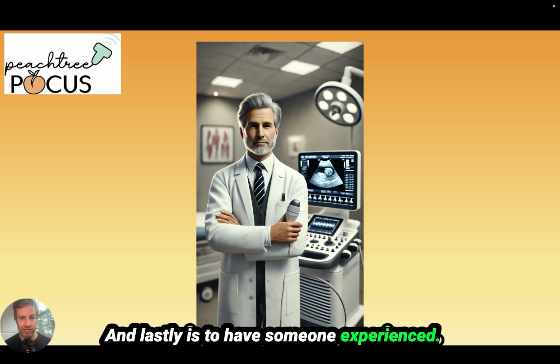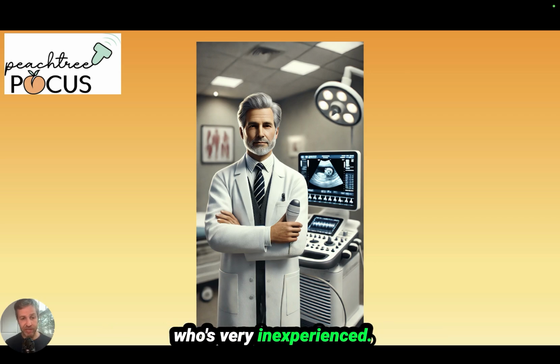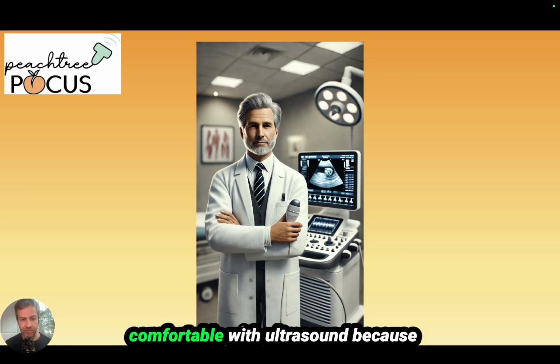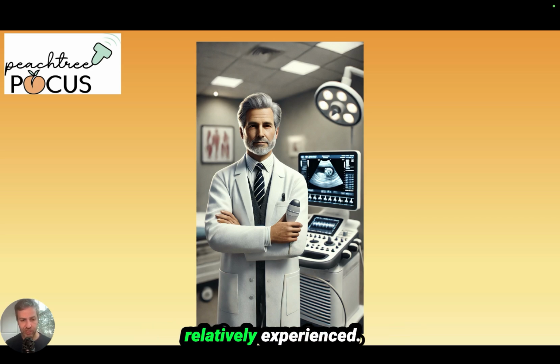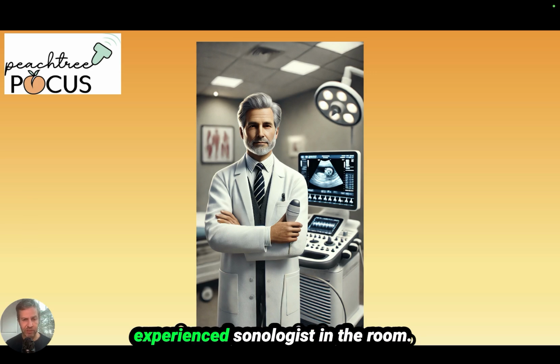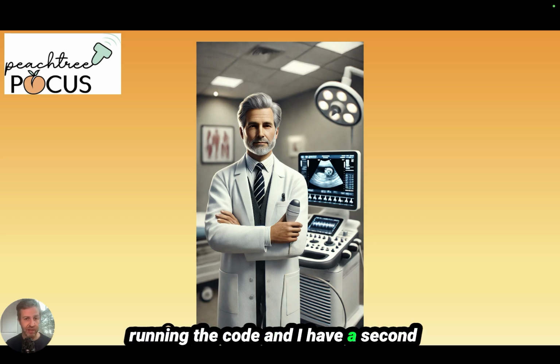And lastly is to have someone experienced. You don't want someone who's very inexperienced, some of their first few times, not that comfortable with ultrasound, because these things have to be done accurately and they have to be done quickly. So you want someone who's relatively experienced. So ideally you have the most experienced sonologist in the room. So for example, during a cardiac arrest, I have a lot of trainees with me. I have senior residents who are running the code as part of their training, and then I will do the ultrasound while they're running the code. It can be the other way around. If I'm running the code and I have a second year resident who's done a fair amount of ultrasound, they can be the ones to actually put the probe on the chest and be that designated sonologist. So you want someone with some experience, not someone who's new.